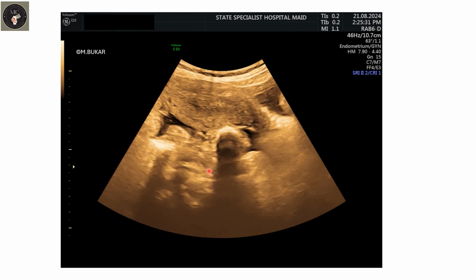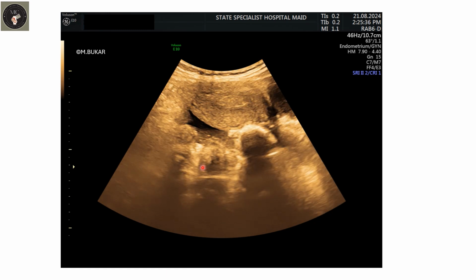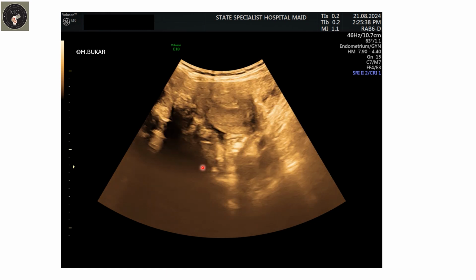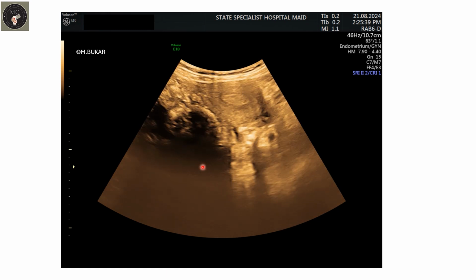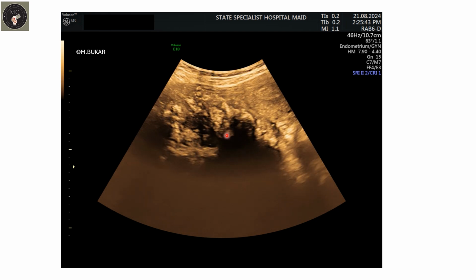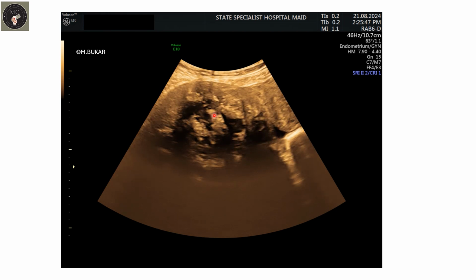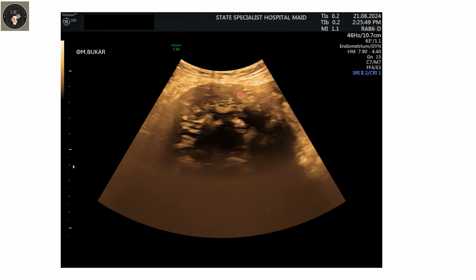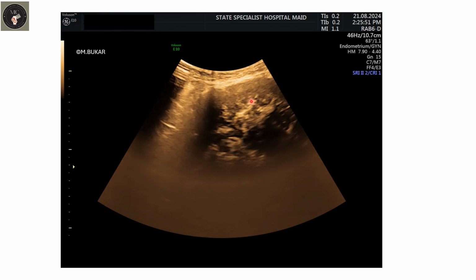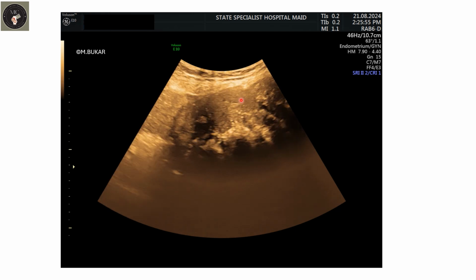Could it be mature cystic teratoma at this age, 60 years? Of course, it's a possibility because of this extensive shadowing, tip of the iceberg sign, and what looks like bright lines and dots, which is a feature of mature cystic teratoma, but not the lobulated nature.